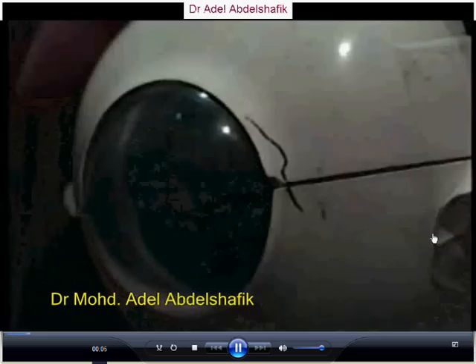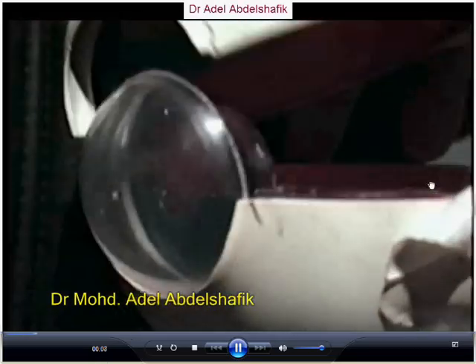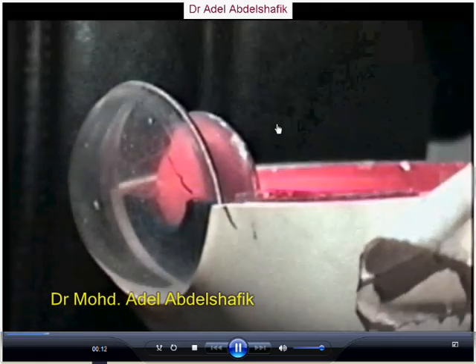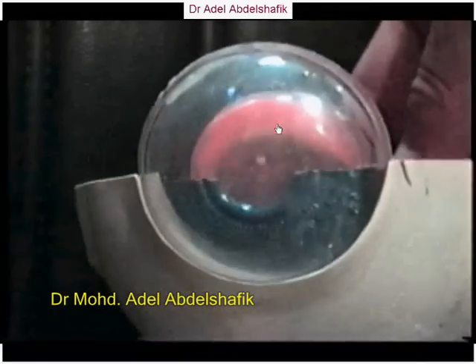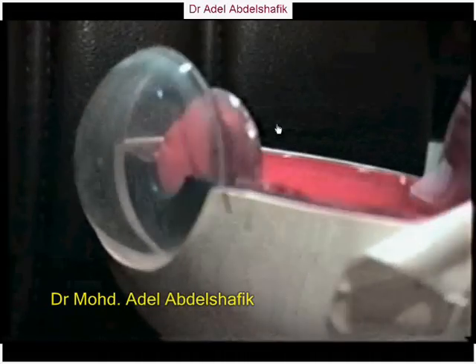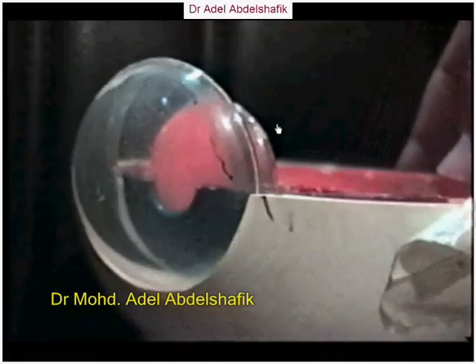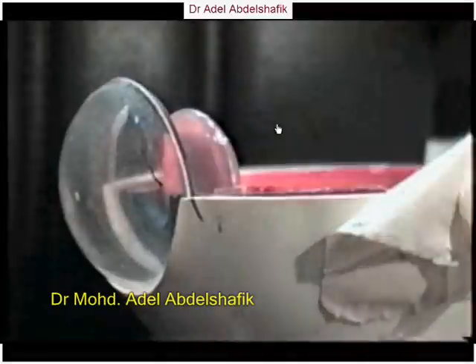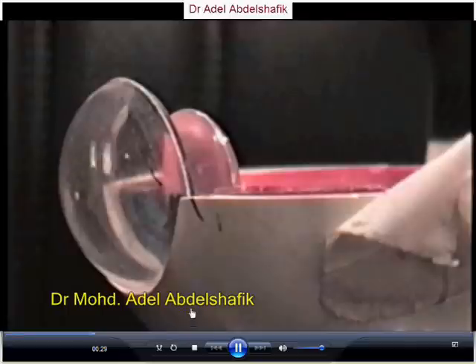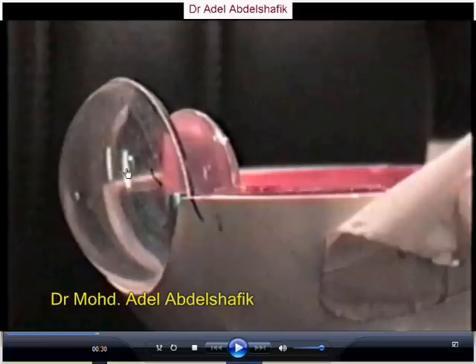This is the model of the eyeball. Here you can see the cornea, and this is the lens. If we throw a light through these structures, as you can see here, this light will make a section in the cornea. This is the anterior surface of the cornea, this is the stroma, and this is the posterior surface of the cornea.